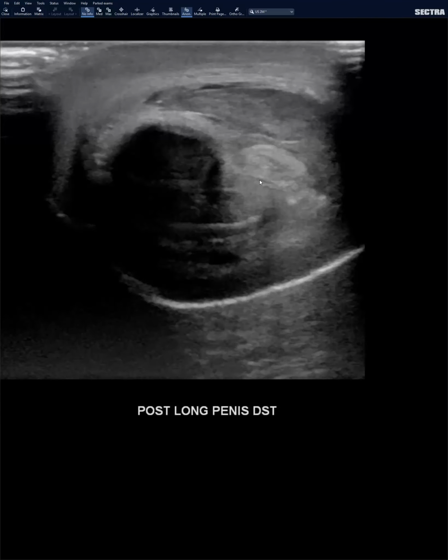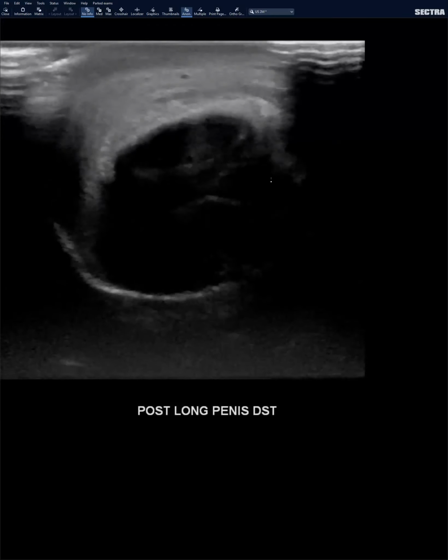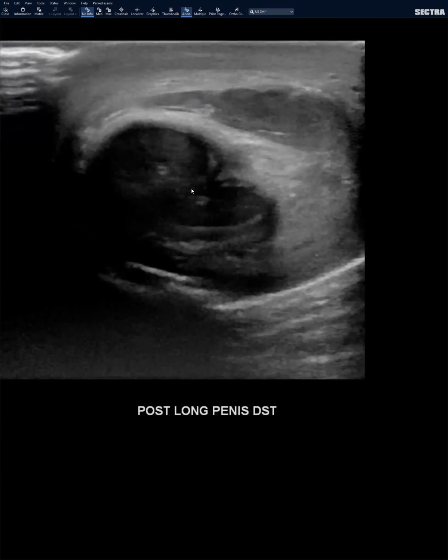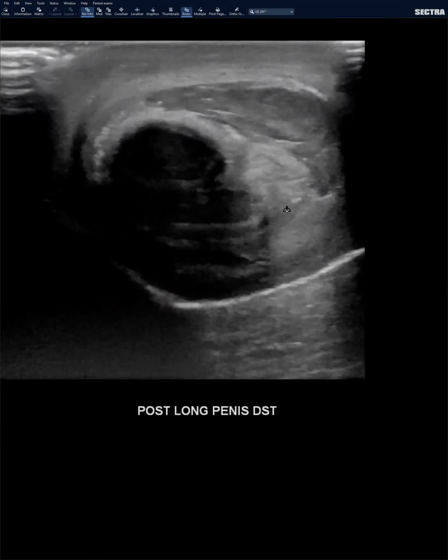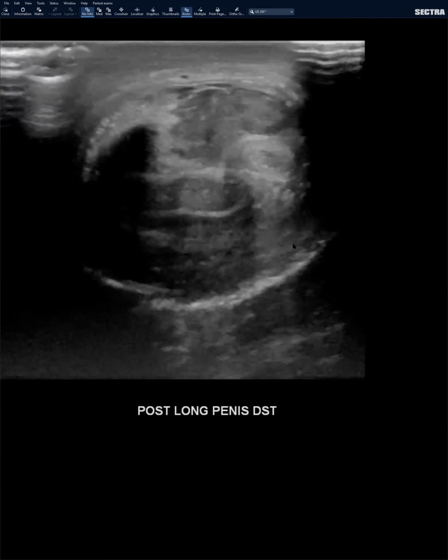I hope that's the right screen and I'm not showing any patient identifier. So the same case that Anu showed. We saw this last week on call, a penile ultrasound again. The images aren't as pretty because they couldn't straighten out the shaft to get those nice axial images, but I'm just scrolling the images to show the same findings.